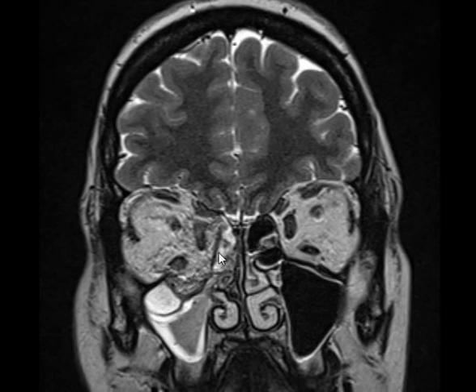So this is an orbital blowout fracture with hemosinus and herniation of the inferior rectus and the medial rectus into the sinuses. Okay. And it's an emergency for surgery since there is muscle herniation. They go from the sinus, push the muscle up and close the defect.